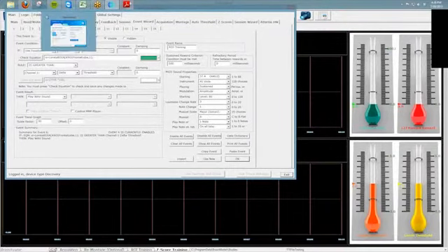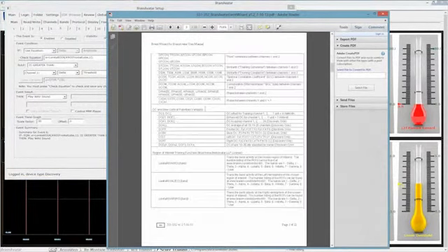Let's take a look at exactly what that means. Loreta ROI A, parenthesis, ROI, comma, band, close parenthesis. So basically it trains the band activity at the chosen region of interest.